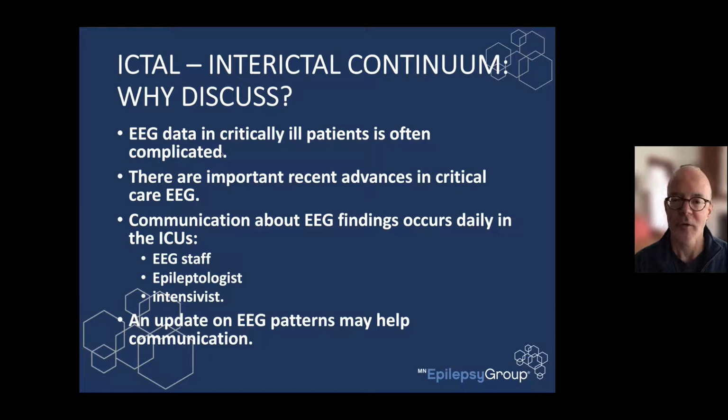These patterns show a lot of epileptiform activity. These patients are at high risk to have seizures. And I think if there's a good understanding about what we're describing, we can be able to say, is it ictal? Is it interictal? And to be able to communicate that between the critical care staff members, the EEG techs, the epileptologists, the intensivists, everyone knows what we're seeing, and I think that will really help with communication and hopefully improve patient care.